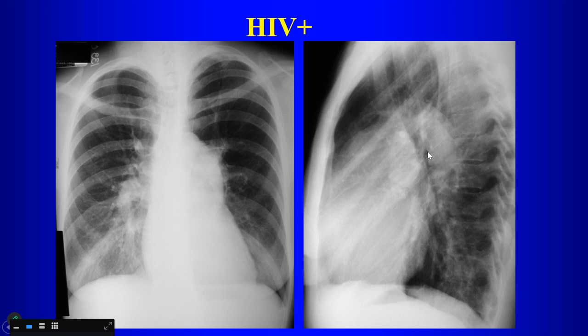What is this guy? That's the left pulmonary artery. How do you know? It's going up and over this, which is what? Left main bronchus, or left upper lobe bronchus, right? What is this guy? This is not the left main pulmonary artery.